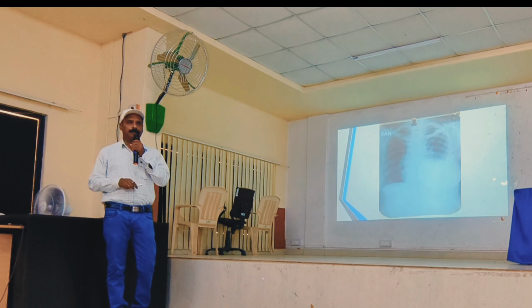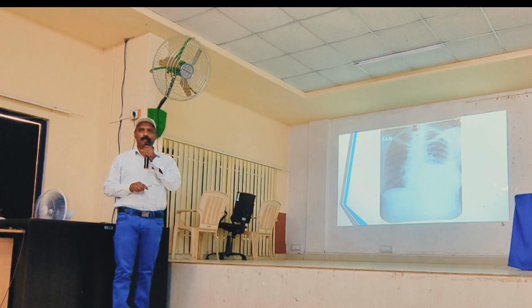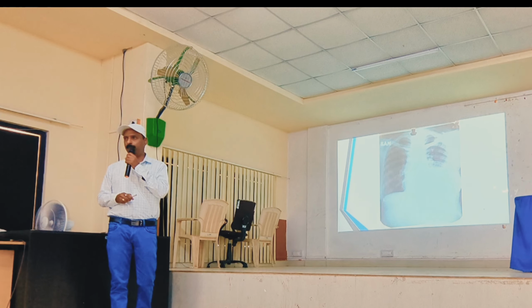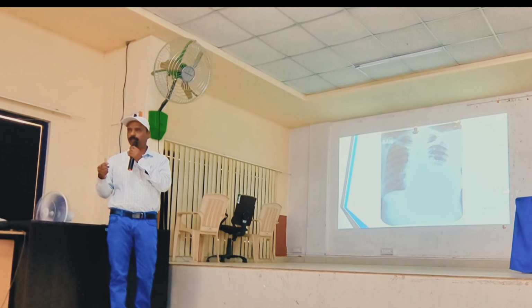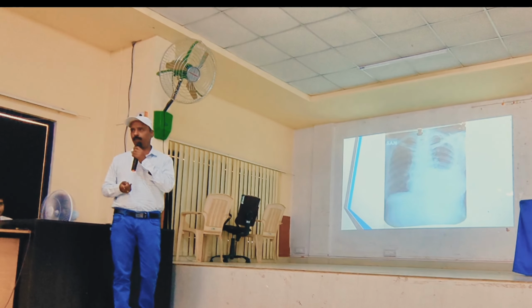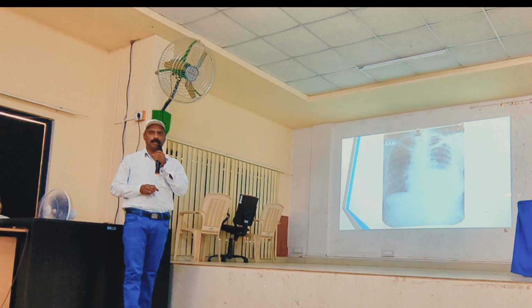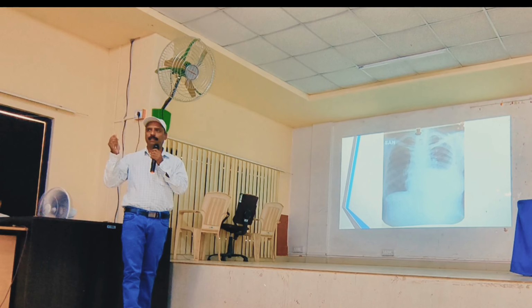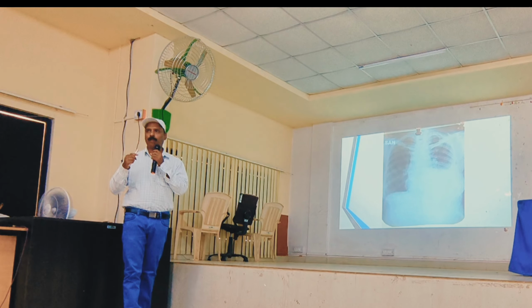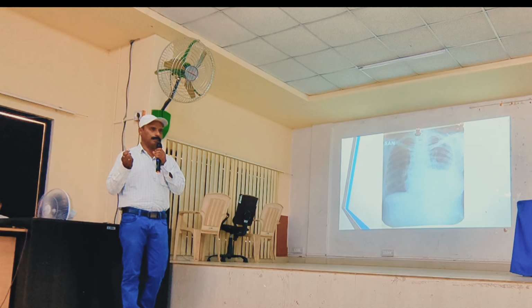Should not be mistaken this as a cardiomegaly, because you have to see heart shadow, even little part of the pericardial effusion, as well as we have the pleural effusion. So abnormal collection of fluid in the pleural cavity, pleural effusion, abnormal collection of fluid in the pericardial cavity we are going to call as a pericardial effusion. So this is just clinical anatomy of heart and lung and pleura. So this is what I am applying, the clinical anatomy in relation to that is a radiological anatomy.